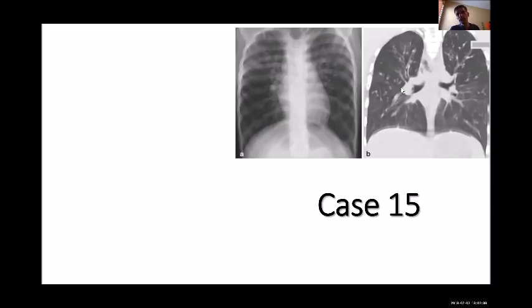So I would say yes, there is dilatation of the small airways. I won't say it's bronchioles. Yes, dilated lower airways. I agree with you. It's softer than yours. It's a sharper word when you say dilated bronchioles. Okay, what else?